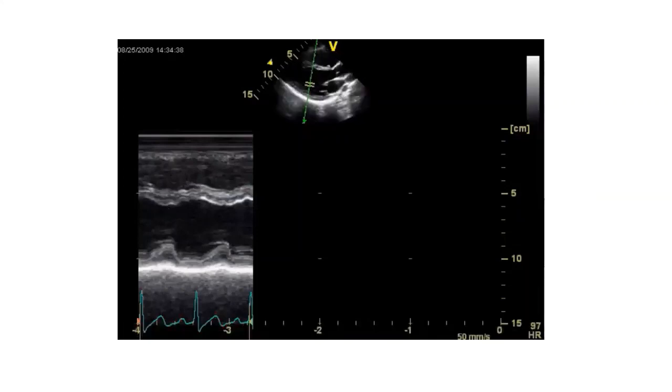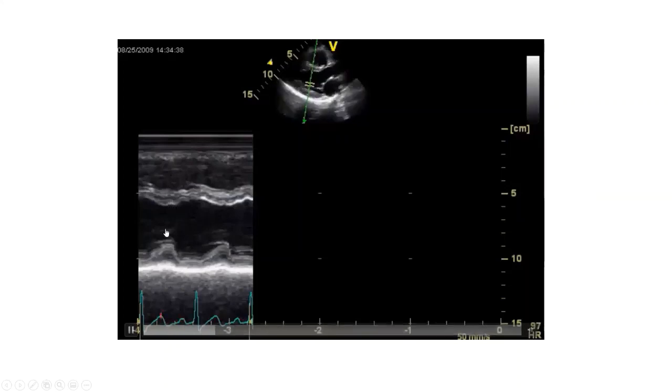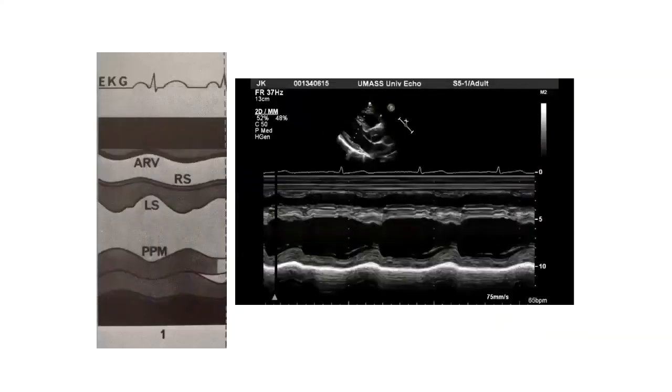So this is just for illustration of what we are actually looking at with the M-mode echocardiogram through the left ventricle. And we are encouraged by the guidelines to make our measurements using two-dimensional on-screen measurements, but until the guidelines came out with this recommendation in 2005, many labs were still using wall thicknesses that were measured either on 2D directed M-mode or on the M-mode itself.